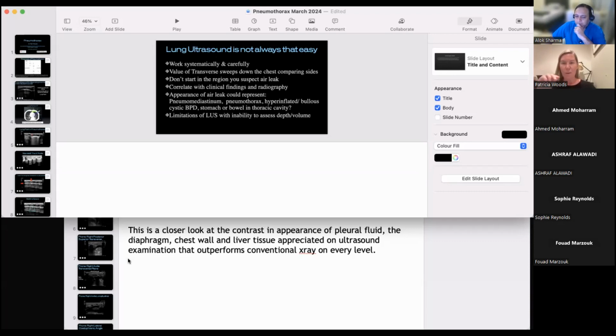You might have bilateral pneumothoraces and even pneumomediastinum if it's been a big resuscitation or something, but it's tiny, so you have to put it back in clinical context. I think that is certainly when an X-ray would be helpful, acknowledging that yes, there's been an early presentation. It might look really different in 2 hours' time, or if you're on a ventilator or something.